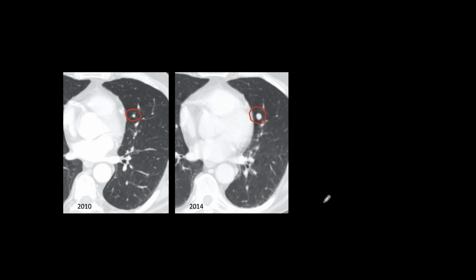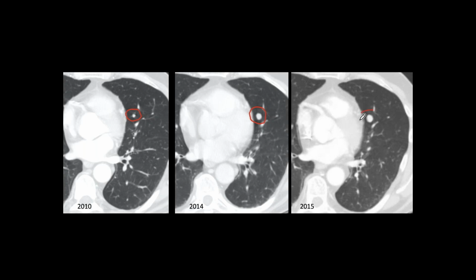And in the recent one that I ordered, the nodule is even larger. It was a solitary metastasis from carcinoma of the colon, which had been missed for 4 years, growing slowly, in the CT studies. So sometimes the lateral film can be even more useful than a CT. Okay, that's an important observation.